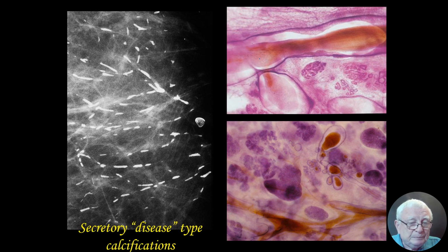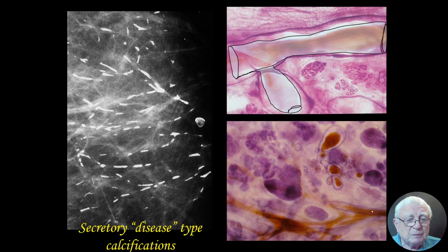Here is the fluid. What do you think the pH value inside here is? It's alkaline. When the cancer fills the duct, then it's acidic. And sooner or later, the water is going to disappear from this fluid. It becomes very viscous, and it calcifies.